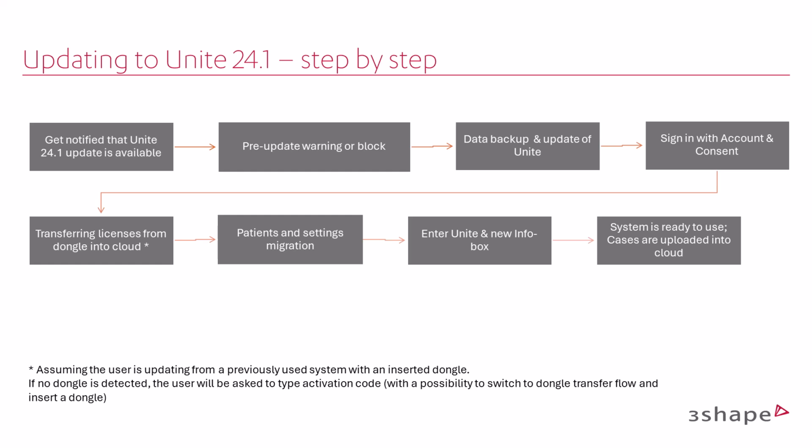Following the license transfer, the system will migrate patient and settings data to the cloud. Once this migration is finished, you'll enter Unite and be presented with a new info box. From this point onward, you'll have access to all Unite features and can create new cases and scan them.